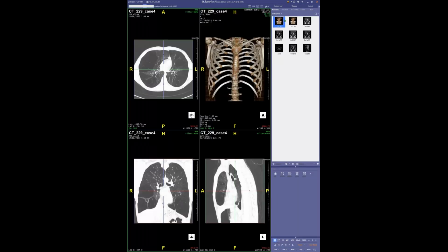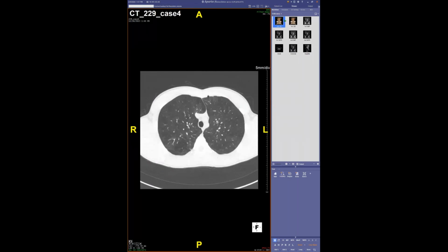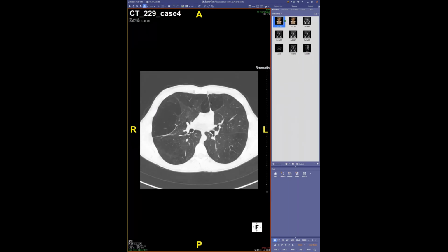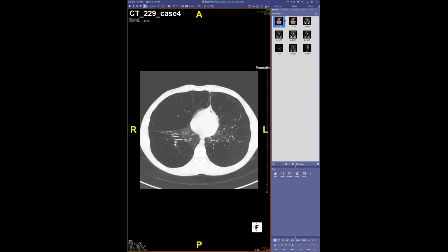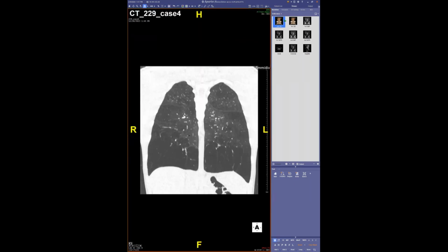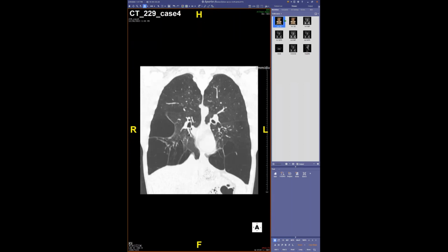And then last, really quick, this is an 18-year-old non-smoker with pretty horrendous panlobular emphysema, lower lobe predominant. All his alpha-1 antitrypsin tests to date have been negative. And here's his dad.